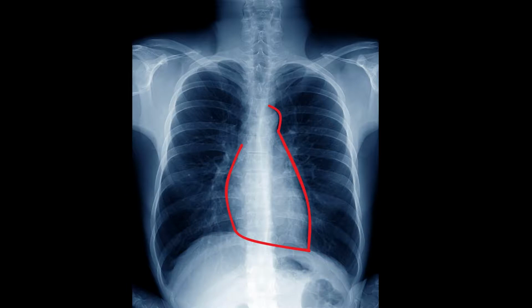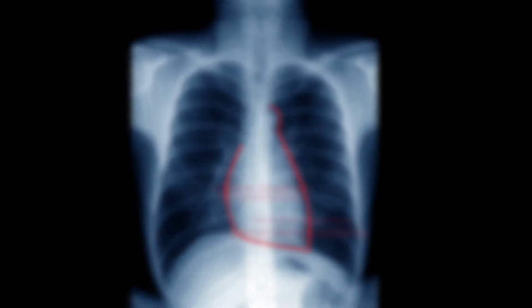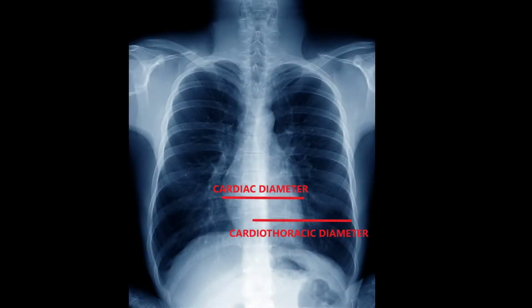It's important to comment on whether you think that the hilum is enlarged. In describing the heart, it's important to comment on whether it is enlarged. This is significant in cases of cardiac failure, where you might see the presence of an enlarged heart.